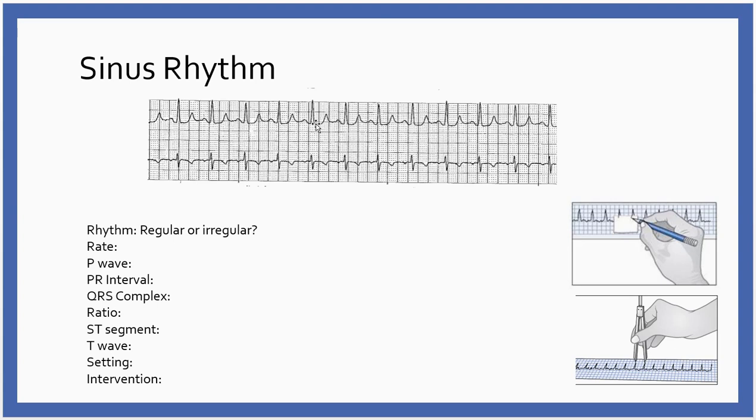So it looks like I'm at two big boxes on that. Maybe a little bit short of 2 big boxes. So it's probably okay. So I'm going to say my QT interval looks okay. All right, so back to, sorry, it's late at night, I'm starting to wander.